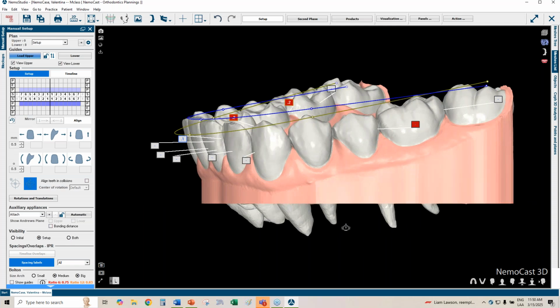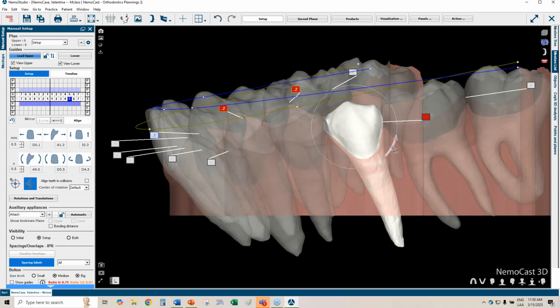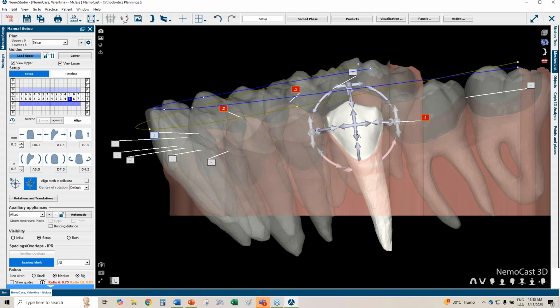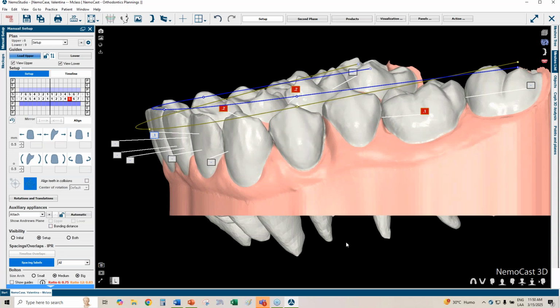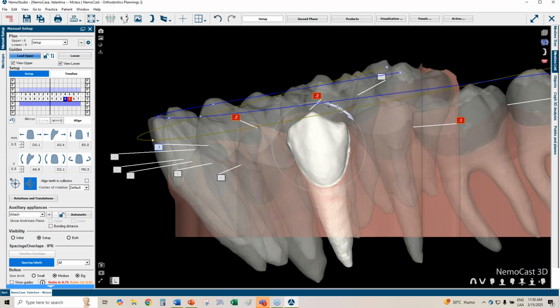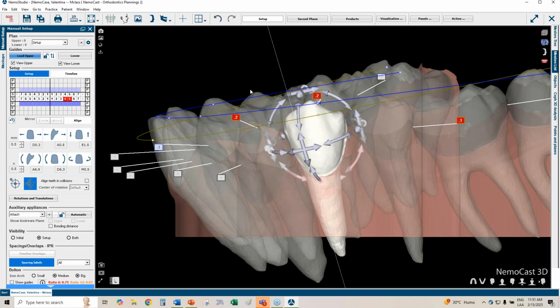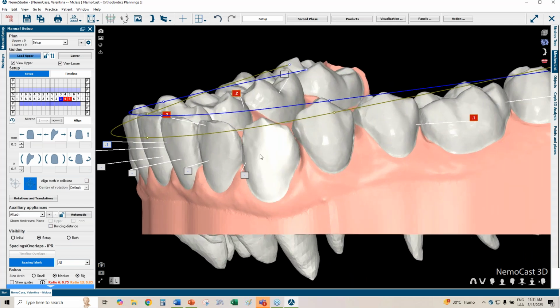So we can start now visualizing if it's going to be possible maintaining the actual therapeutic, or if it's too much. For example, if I want to go all the way up here and I'm already visualizing, hey, this is going to take a lot, then I can start visualizing if it's going to be useful for my treatment or not, right? So if I'm going to be able to perform it like I want to.